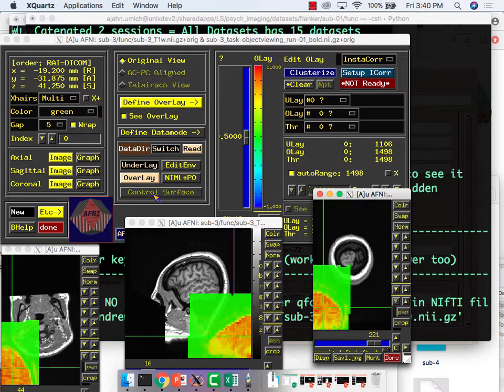They've got those other move options like ginormous. There's ginormous move. Are those not in the GUI? They're not, yeah. That's actually something I prefer to do. What we're going to do is stop the preprocessing right after it does normalization and check it, in case we need to switch something else.